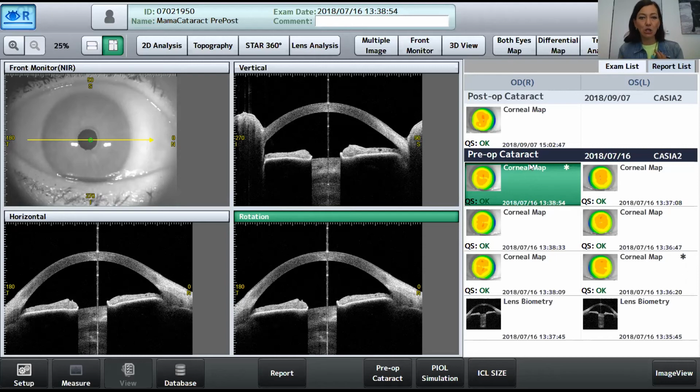So there are a lot of different features and possibilities that we have, and we cannot put them as a default setting for everybody. So what we are offering are so-called customized scans. And these customized scans can be established by you. And I'm going to show you the possibilities we have. Of course, it is always nicer that you can try it later on, but I would like to show you today the possibilities we have.